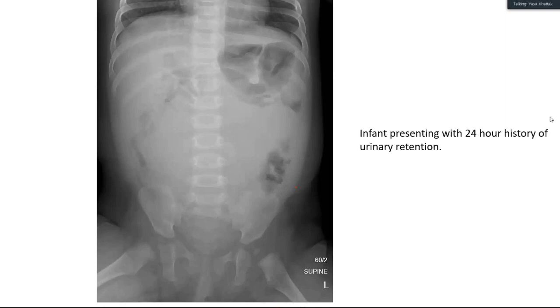First of all, for all the participants, residents, if you see something on any kind of image that is provided to you by the examiner, the first thing, if you see it's very abnormal, clench it and take some time to explain it. So for example, in this particular case, you mentioned that there is a soft tissue opacity, right? Yes, sir. In the middle. So don't leave it and go straight to the stomach. And take some time, because that might sometimes be the only abnormality, and the examiner might be interested only in that. So take some time.